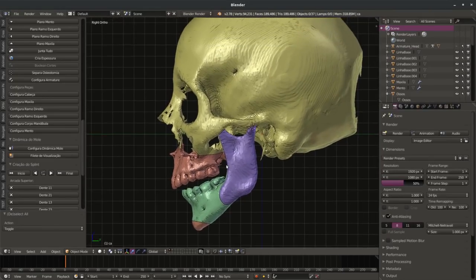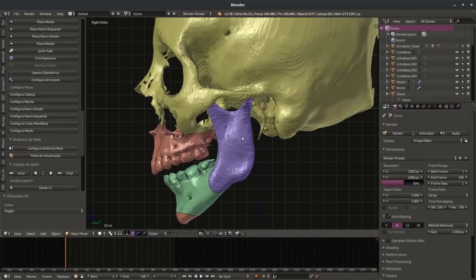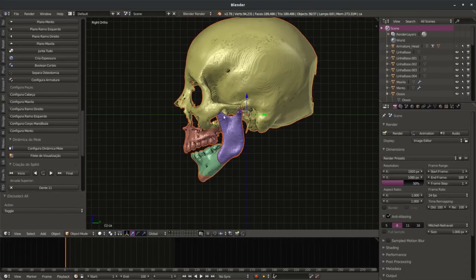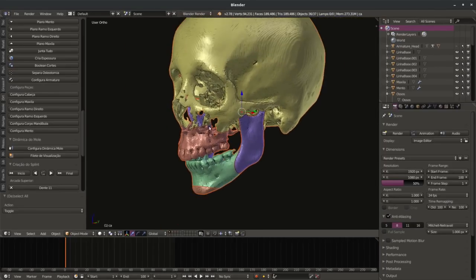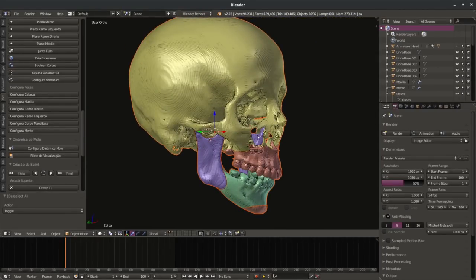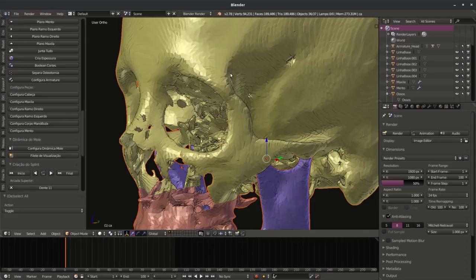The first thing you have to do is I will expand it here. I will change the end value to 100. Okay, so we have 100 keys. The second thing I will do is select all objects in the scene, all bones in the scene. So you have to take care to keep only the bones in the scene.